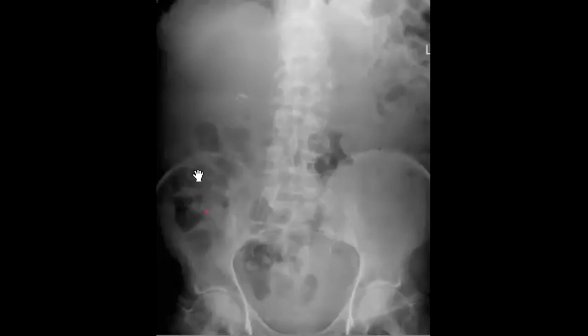The bowel gas pattern is fine, unremarkable, no intramural gas, no free gas, no gas in the biliary tree, the good negatives. Some degenerative spine disease. Okay. They like you to mention that there is also some calcification in the aortic and iliac branches, as you see here. So aortoiliac and maybe femoral calcifications as well.